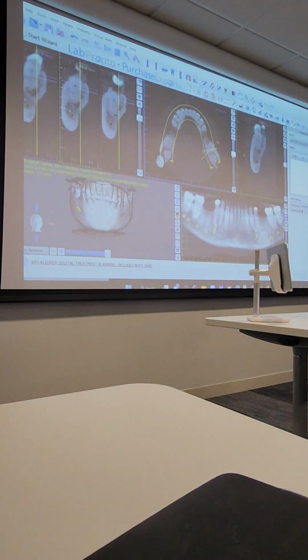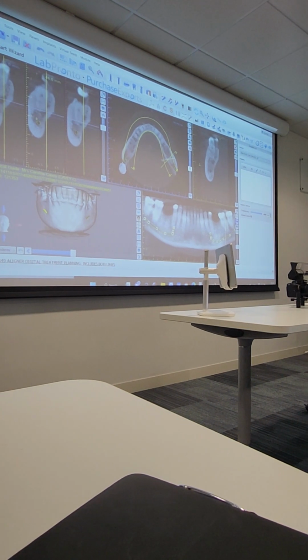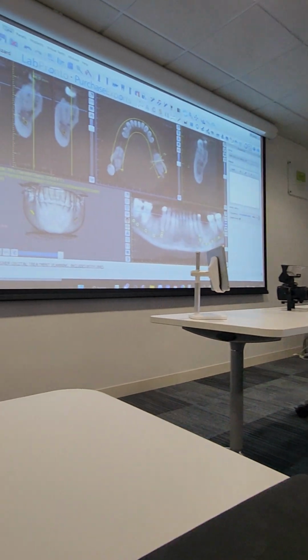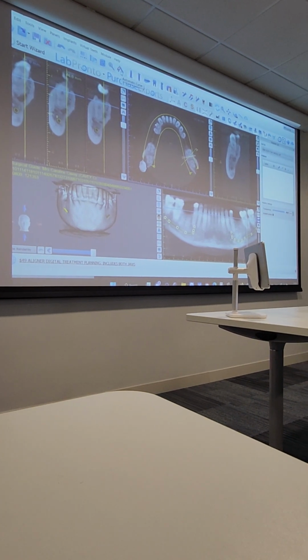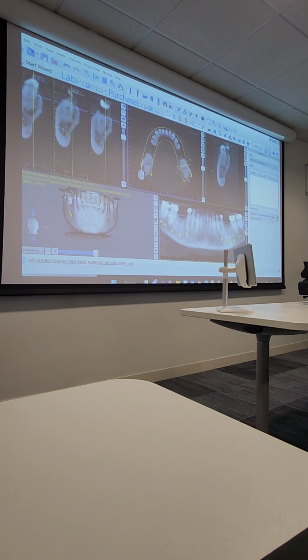Most of the time it's accurate, but sometimes it's out. So if you want to be able to see a good view in your other windows, you have to make sure you set your panoramic curve. So again, you've got everything up here as well. If you learn these, it's so much easier and quicker. And if you go on top of each button, it tells you what it is.